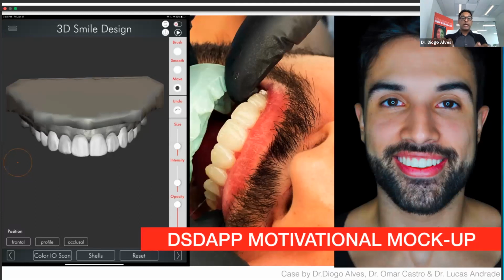So you will be taking, as I was showing you guys before on the previous screen, that ideal mock-up, you would bring those 3D teeth a little bit outwards. So you would be covering the patient's existing teeth. You would print, create an index and a bisacryl so you can do your motivational mock-up.